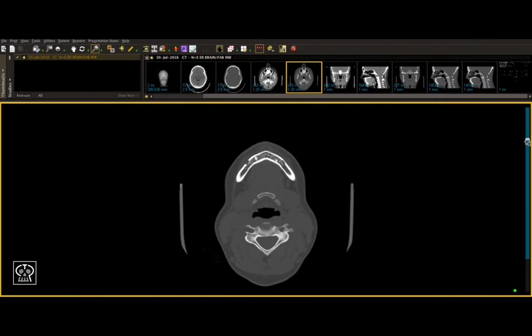This is a common beginner's mistake when looking at CT scans, thinking there might be pathology or a fracture here through the outer cortex. But as you can see on both sides, this is just the mental foramen and the inferior alveolar nerve exiting through these foramen.